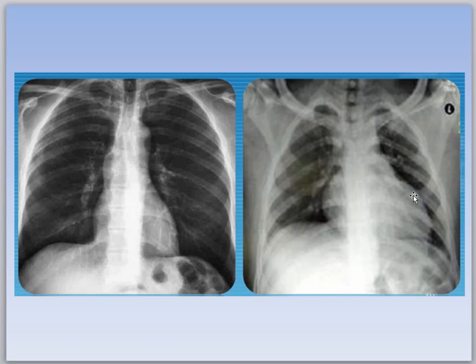Just like any muscle that a bodybuilder works in the gym, the heart can get big, so the left side of the left ventricle gets really big, and this, of course, can be dangerous because it can constrict the blood vessels to the heart itself. But this is an example. Make sure you know this. This is left ventricular hypertrophy. So if you see this out there in the test, left ventricular hypertrophy.